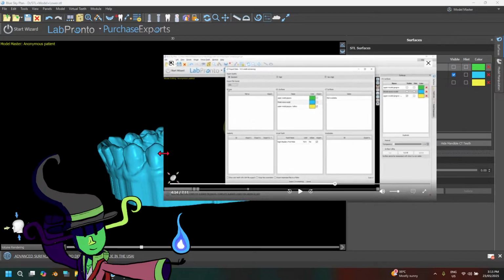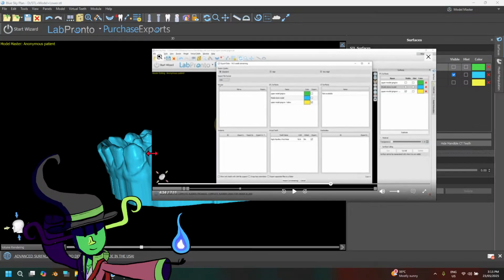For me, when it comes to 3D printing, I don't think there's really any difference between OBJ and STL. If you're gonna be an animator working on 3D models, OBJ does have some use, like it can store shader data inside it compared to STL. But to me, they're basically just the same in the 3D printing world. As well, not an issue.